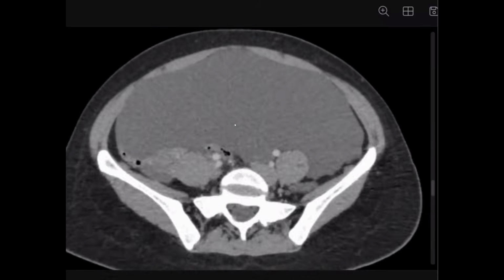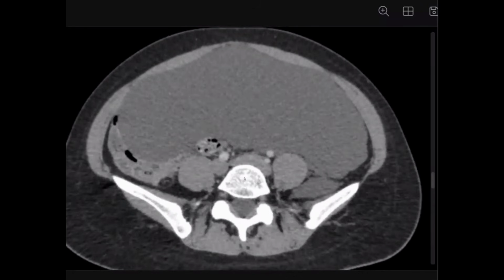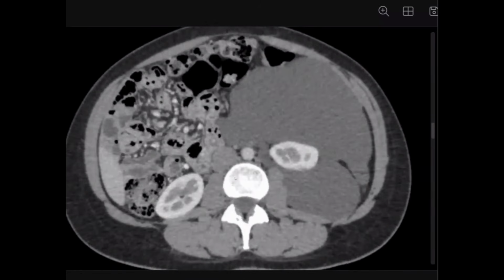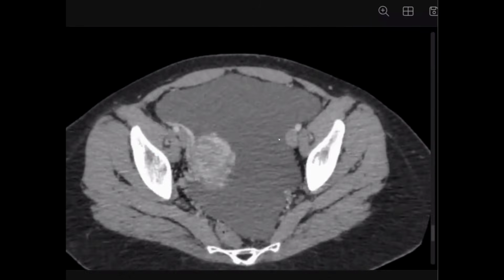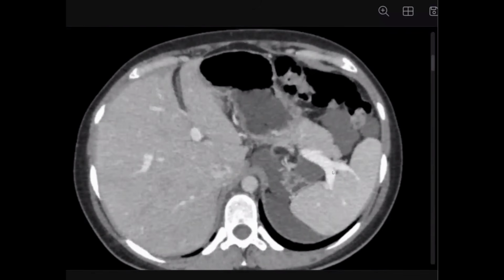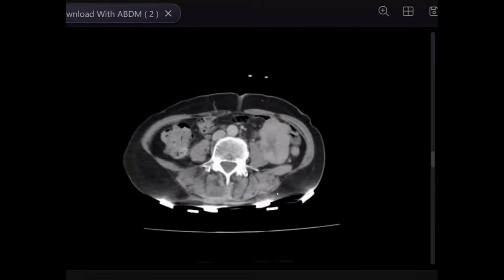So this one is peritoneal. It's not retroperitoneal. So we have a mix of retroperitoneal and peritoneal spaces, and this is one of the most characteristic features of lymphatic malformation: transcompartmental extension. It is not bounded by reflections. It is crossing between retroperitoneum, peritoneum, and different retroperitoneal spaces. So this is a classic feature of lymphatic malformation. Perfect. Okay. This case was complaining of left loin pain.